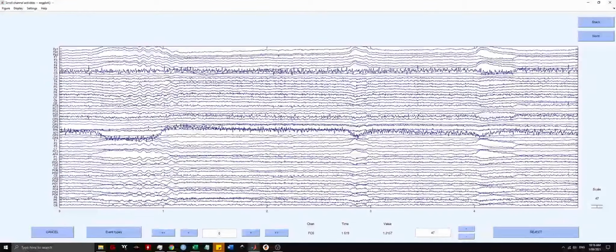You can see that the EEG traces look different from before. And you can see that there are two channels that are a bit noisy. This is T3, and this one you can't really tell, but it's actually IO1, which is the eye blink channel. So the next thing you could do is find a way to deal with these bad channels. But before we deal with those channels, I like to filter the data.